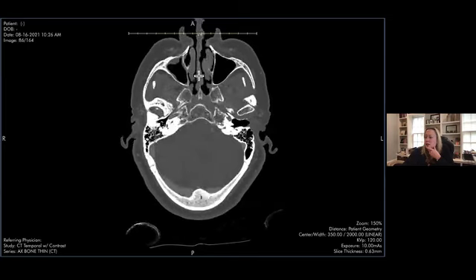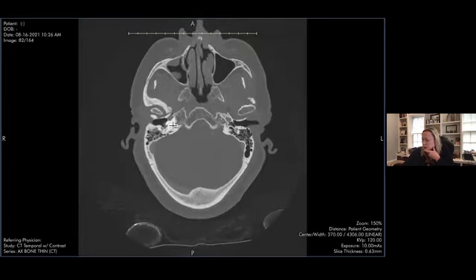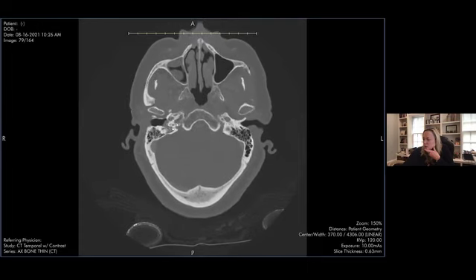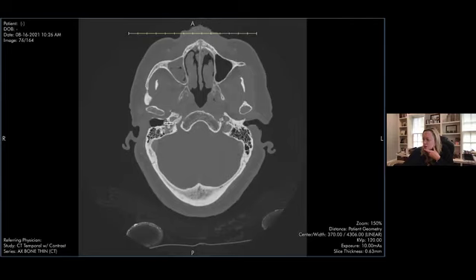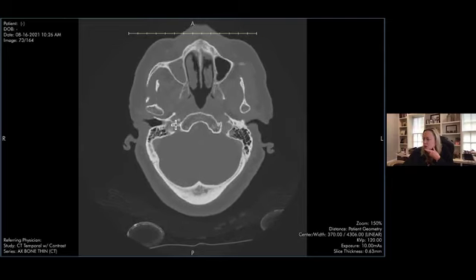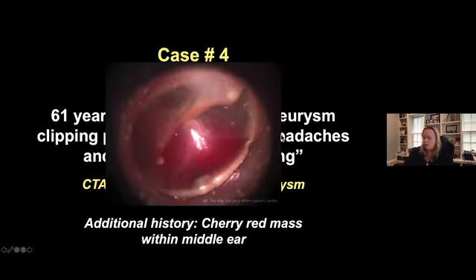On these thin section temporal bone CT bone window images, you can make out on the right in the hypotympanum, we're a little angled on this patient, but compared to over here, you see abnormal soft tissue. And then maybe you can make out that this bone doesn't look entirely normal. Look how dense and white this bone is on the other side. And there's a permeative bony erosion here coming down from the hypotympanum towards the jugular foramen. Okay, so those are the images. Let's go back to our PowerPoint and we'll go over them.